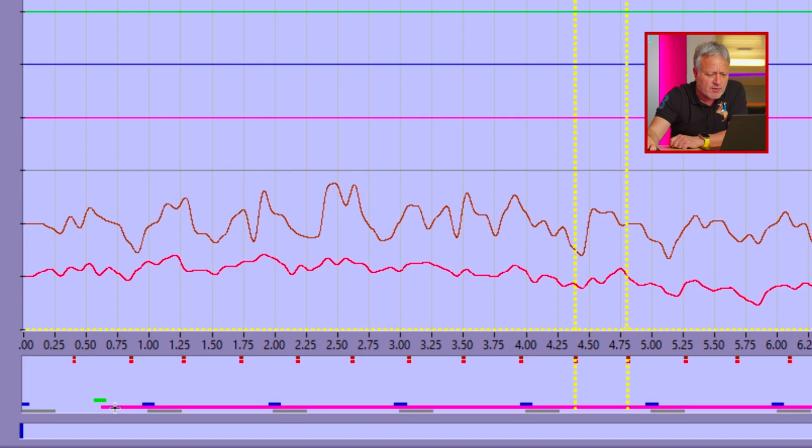As for the Active 2, it triggers from positive to negative, so from high to low. That's why when we send a trigger to the Active 2, it should actually just give one purple marker as we start recording, but it doesn't. It gives a continuous line because it goes to high, but then because it stays on the 5 volt level, it's just a purple line all the way through.